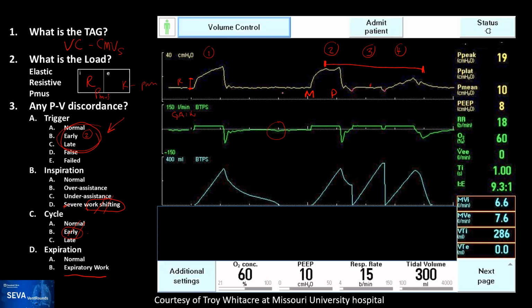Could that have been a patient trying to trigger but failed? Yeah, that could be too, Hara. The gain is so little that I cannot see if it's moving up and then down. And sometimes you can see that the patient took a breath in and out. So yes, I'm saying that there's increased resistance in this patient.